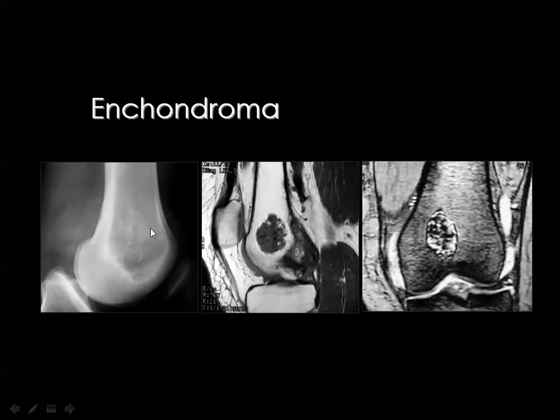You see in the plain X-ray some bone sclerosis. In the MRI, you see a low signal lesion with internal dark foci of calcium. In the T2 weighted image, the lesion will be bright with the sclerotic margin and the internal foci of calcification. Then the radiologist will leave the whole evaluation of the knee and concentrate on this particular lesion, which is an incidental finding, and start to describe it in full detail, considering the signal, the length and the width.